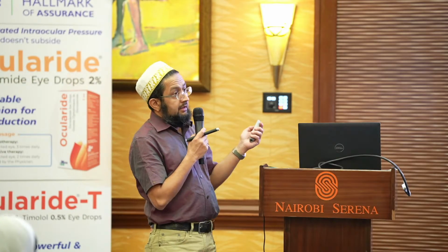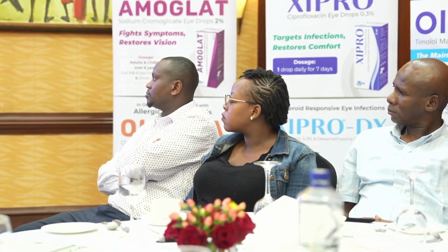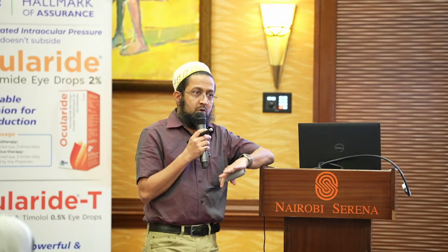That was ARN, acute retinal necrosis, and this is PORN, progressive outer retinal necrosis. So you can see here in this image, these necrosis in all these areas. Now, we have a case we saw 3 weeks ago in Kenyatta. One eye, post-trauma.